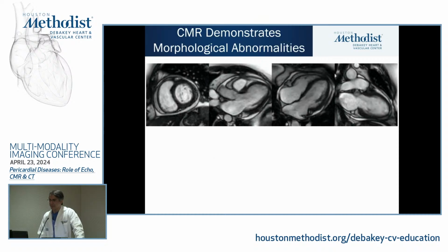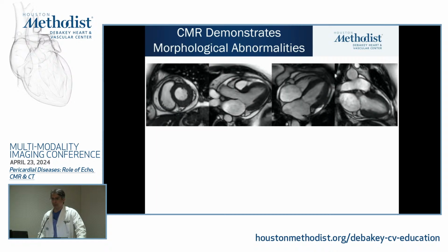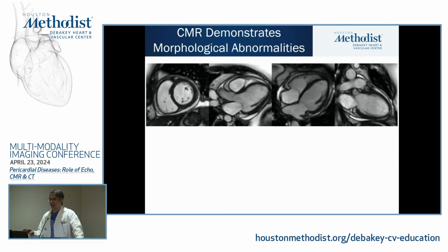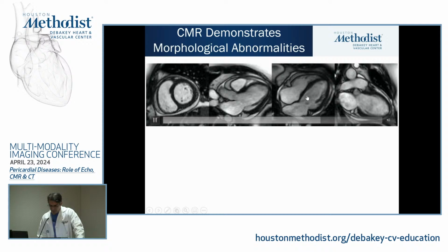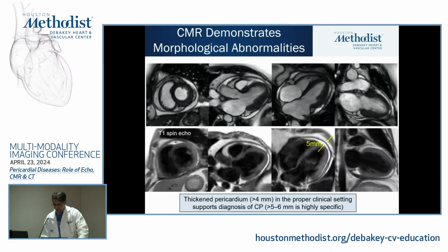And the reason for this is that not all cases of constrictive pericarditis need to go to the operating room. A lot of these cases will be transient, and we will see demonstrable evidence of that with findings on our CMR that can lead you down the path of anti-inflammatories before you consider surgery. So here are the SSFP images. Again, you'll have to take my word for it. You can actually see the pericardium here. It is thicker than normal, and you see a concomitant pericardial effusion as well.